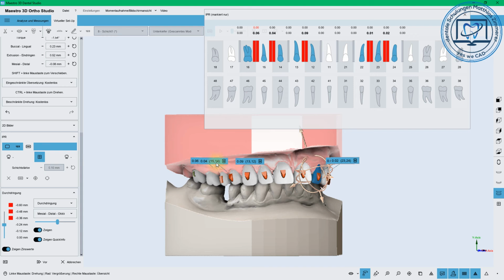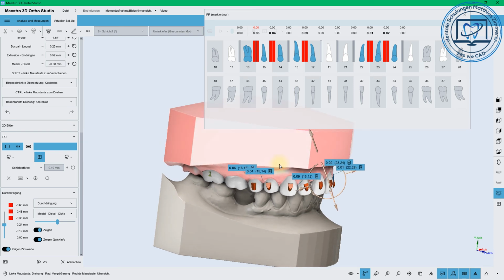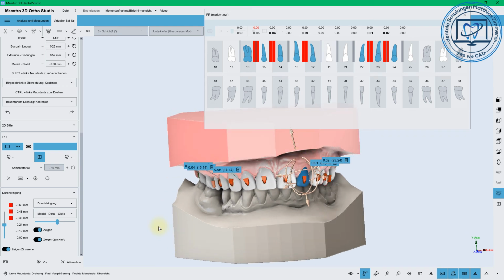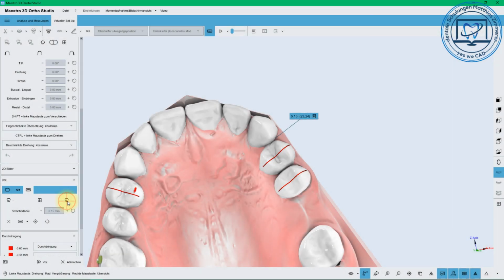Yes, the other thing is you will see the saw, and yes, but do we really need this? I don't think so. I think it's enough to give in the numbers and have the space and just make the setup good. And this is the better way, I would say.